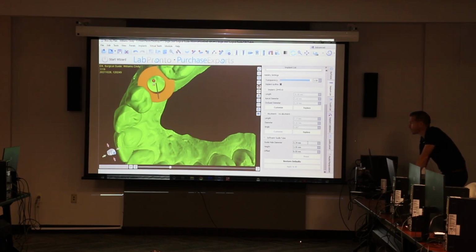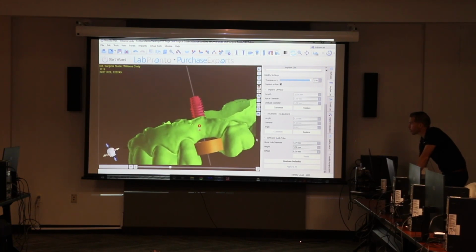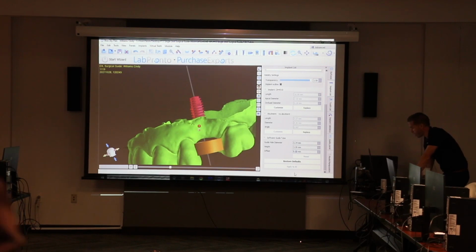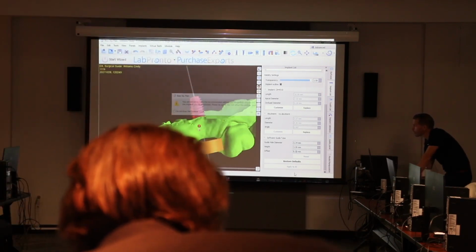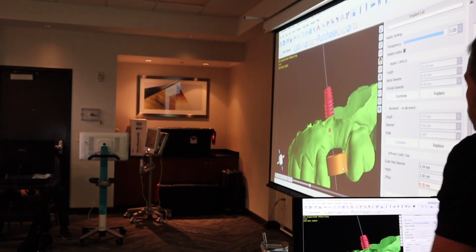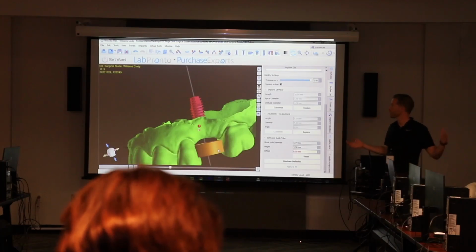Let's do that so that you guys get practice doing that. What I want to do is show you this view here. If I go and change 8 to 8.5, watch the top of the guide tube drop when I hit enter. And ignore these error messages right here. So it just dropped. So I just raised that guide tube up 0.5 because we're not using any metal sleeve.